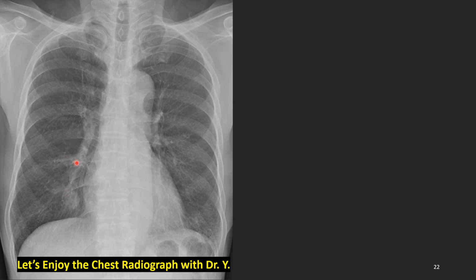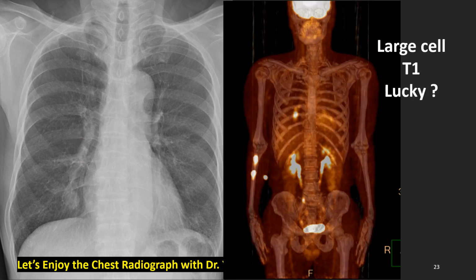SPN. Stage seems to be better than the other patients. After examination with contrast-enhanced chest CT, brain MRI, and this PET-CT, we concluded that he has only a tumor here, T1 staging, no lymph node, no distant metastasis, so T1, N0, M0. Actually, he's unlucky because he has lung cancer, and unlucky because his cell type is large cell. But he's relatively lucky because his staging is so good, T1, N0, M0. So he was operated and is still doing well. But we are still somewhat worried about him because of his cell type.